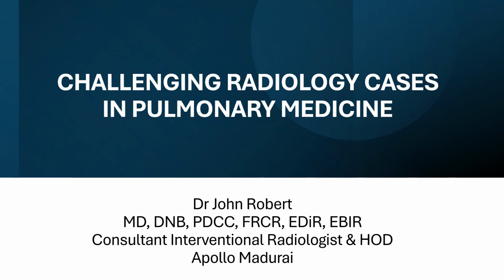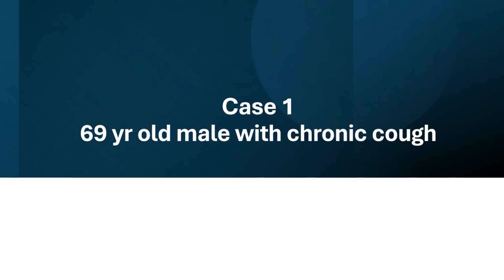Hi, good morning everyone. Today we'll be seeing some radiology cases in pulmonary medicine. There will be four cases we'll be discussing today. The first case was a 69-year-old male who came with chronic cough.